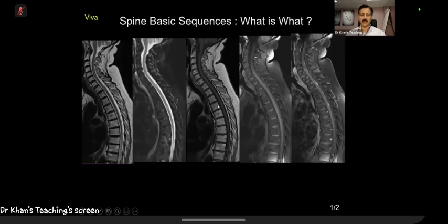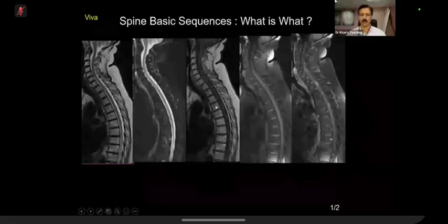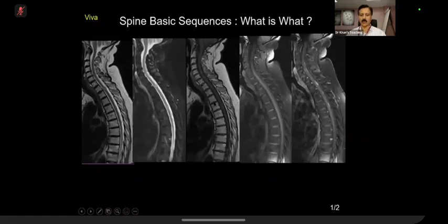Now, this case is quite advanced in age. In a younger patient, the marrow will not be as fatty. You know the basics that marrow has got a red component, red marrow, and fatty marrow. So it might not be all that fatty. And if you are doing a paeds case, then it becomes very difficult. So the key formula is that the marrow should not be lower in signal intensity than the intervertebral disc. These cases have come in the exam where they will show you diffuse marrow abnormality, and if you don't know this formula, you're not going to pick it up.